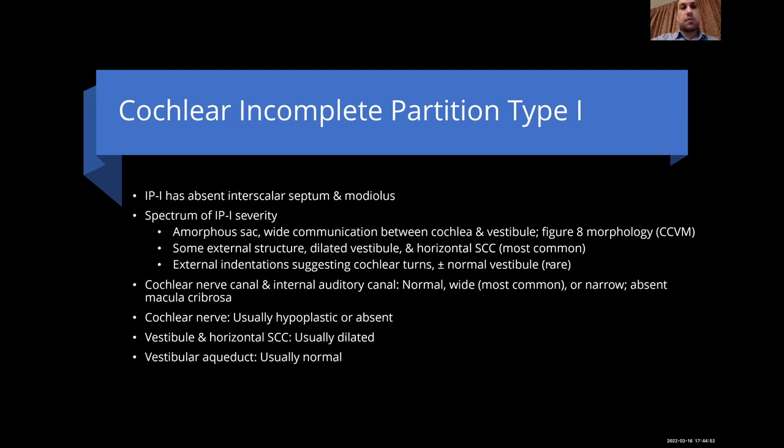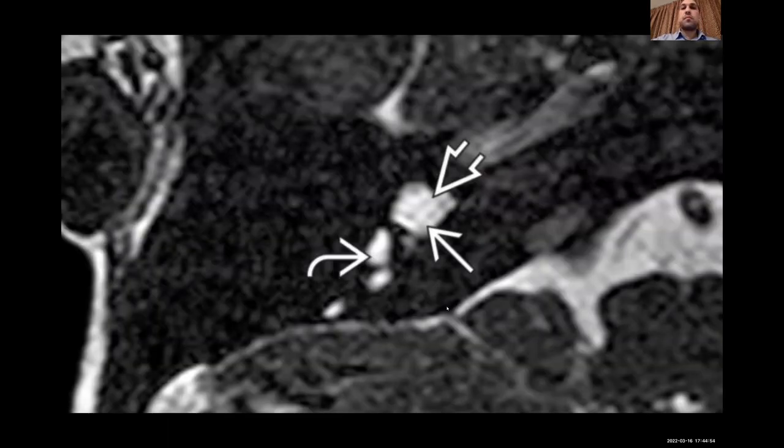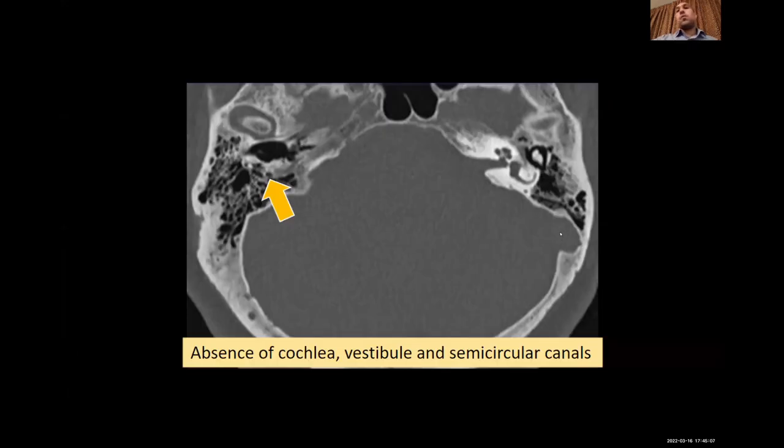Yeah, true. Great. Okay. Here it is. The vestibular aqueduct is not dilated. There are no turns at all. The vestibule is disfigured or mildly dilated. Okay. So what is this? Compare between both sides.